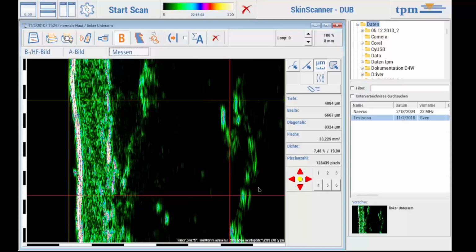If you want to make a very fine adjustment, you can also move the lines using the control pad. The color of the arrows indicates which line you want to move. A left mouse click on the point in the middle and the colors change. Now you would move, in this case, the yellow lines above.